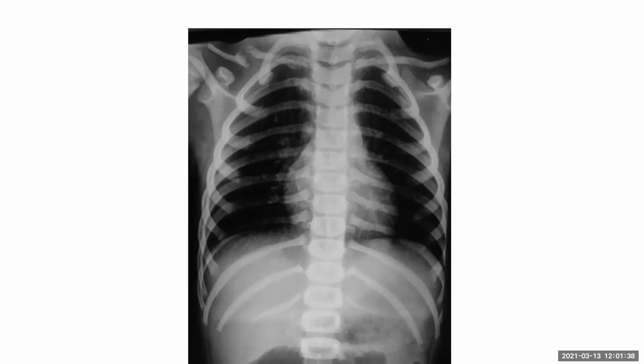There seems to be a degree of periosteal reaction and callus formation, which indicates that this is not acute. I'm now looking at the adjacent left clavicle, the scapulae, and the ribs, trying to look for any other fracture. I'm failing to see any.